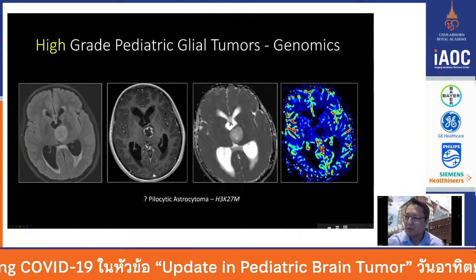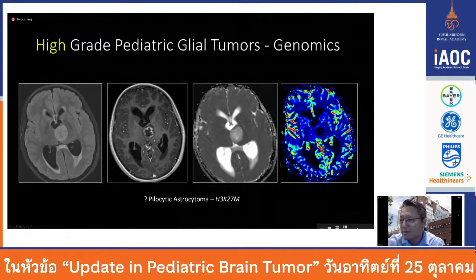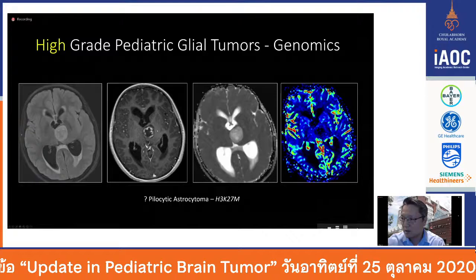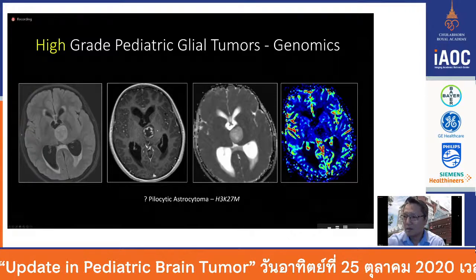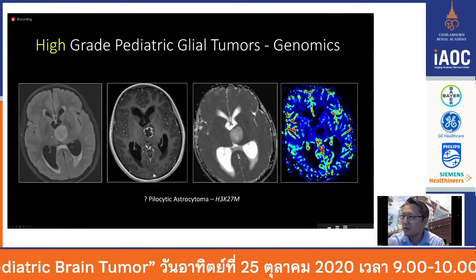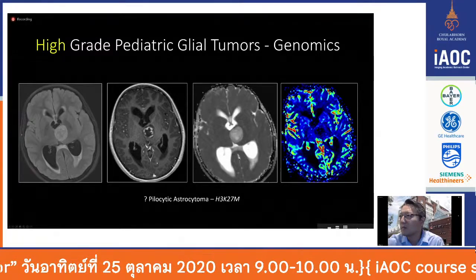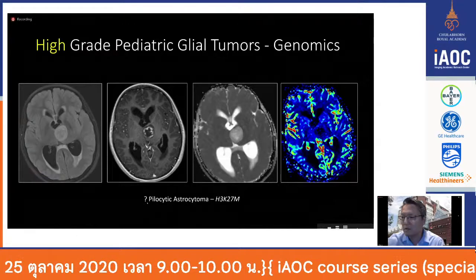And so my colleague, who read this and is very good, thought this could be a pilocytic astrocytoma. And pilocytic astrocytomas certainly can do this. They like to live around the third ventricle. Under pathology, they even saw some cellular histopathology that suggested pilocytic astrocytoma. But we went ahead and asked them to do H3K27M mutation, and lo and behold, it was actually positive.